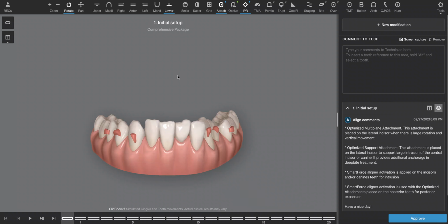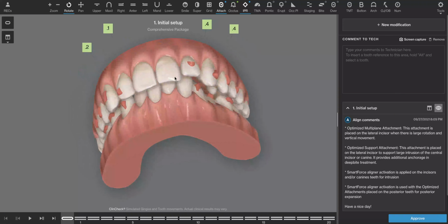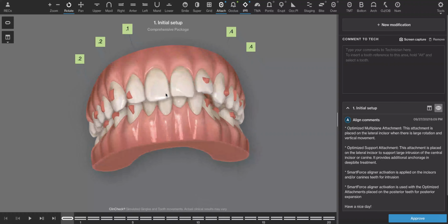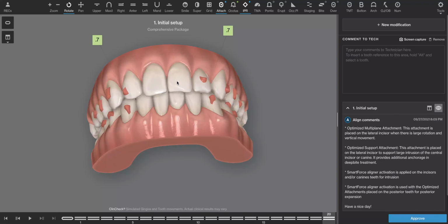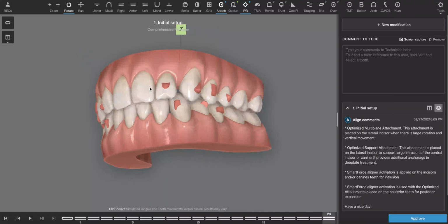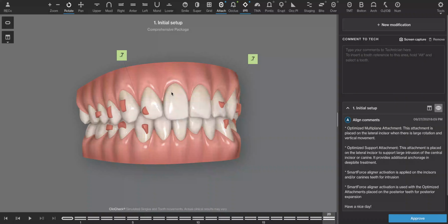I'm going to make the argument that we should always stay away from retraction because that inhibits the palatal vault, or the size of the garage for the tongue. Instead, what I'd like you to program is to tell the lab technician, the Invisalign technician here, to remove all lower IPR. And I actually don't think any was programmed here. Yeah, it looks like they already did what I was going to propose, that they do restorative space on the upper instead of IPR on the lower.